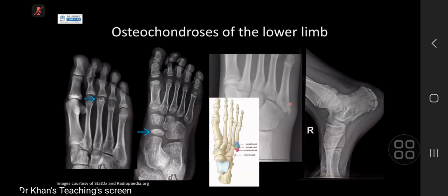Don't confuse that. Apophyses are always vertical, fractures are transverse, lucencies are transverse, and you've got stress fractures, Jones fractures, but essentially if there's a fracture there, you call it a transverse lucency. And of course, you get Sever's disease, which is fragmentation and sclerosis of the calcaneal apophysis. There are a lot of normal variants that can look like that, similar to the apophysis here. So if you see sclerosis, don't always call it Sever's disease. Just correlate with the patient's symptoms, because a normal apophysis can also look like this.